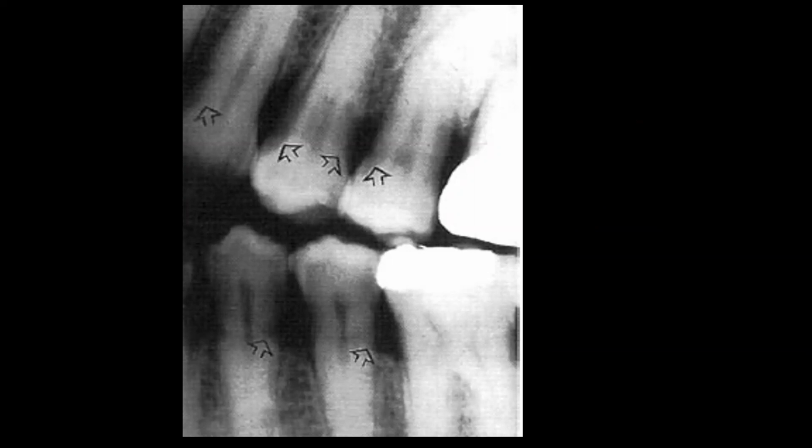This is actually happening due to a differential absorption in this region of X-ray beam due to the anatomical variation, usually due to the curvatures on the posterior teeth, etc. So you can identify the cervical burnout or true caries lesion by clinical evaluation or by thoroughly looking onto the radiograph, where you can see that in true caries lesion, the edges, the outer surface of the edges will be lost, whereas in cervical burnout will be intact.